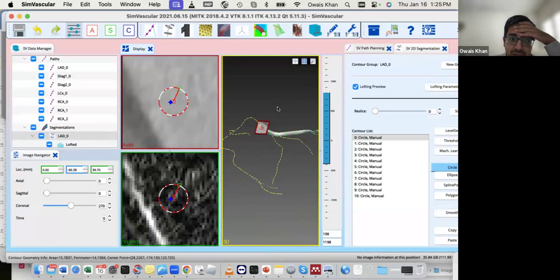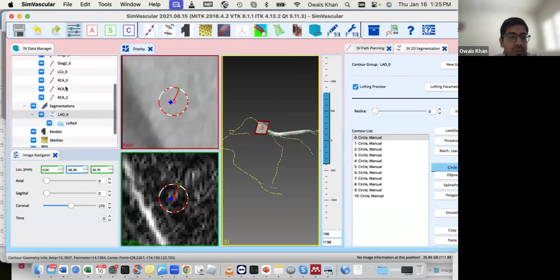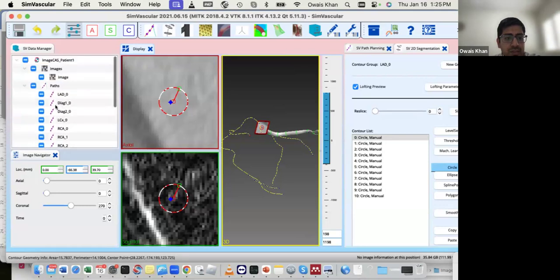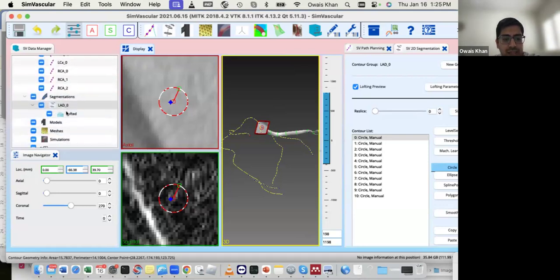And we can see if there are any errors and any corrections that we recommend. And then every week we can try to do these with different patients. So today we're gonna go through the path, and then you're gonna follow the segmentations. And then lastly, the week after we can build a model and a mesh. Once you go through the whole pipeline, hopefully you'll be an expert by that time, once we correct all of the different things.